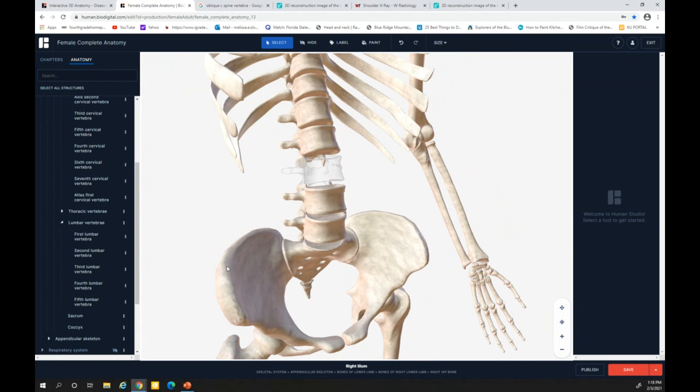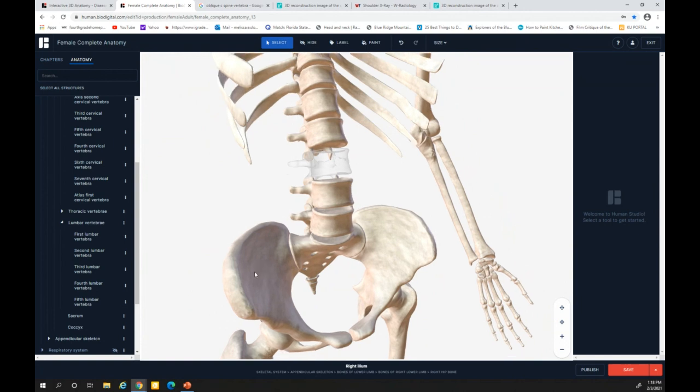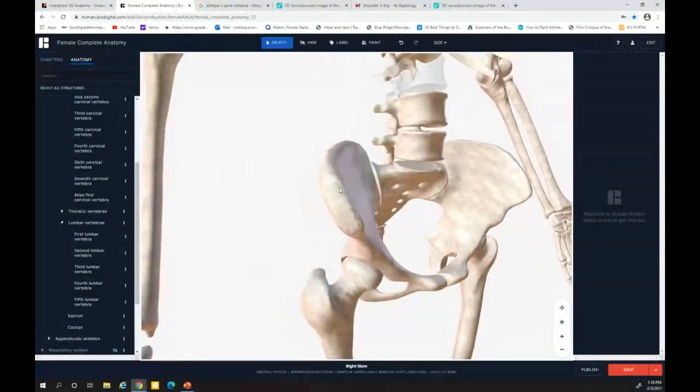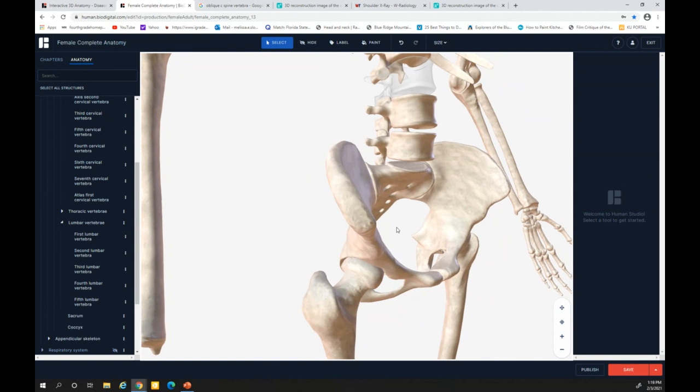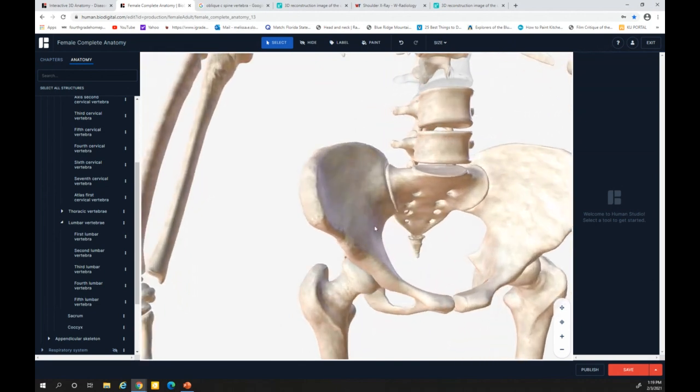I keep drawing your attention to that white line that you can see in the foreshortened one. It's that anterior part of the bone as it keeps superimposing. You see how it gets thicker and thicker, and then it makes that white line. It looks like it's folded over. You can see a white line here on your x-ray where those structures are superimposed and really thick in that area. So it's another way to look for that foreshortened ilium.